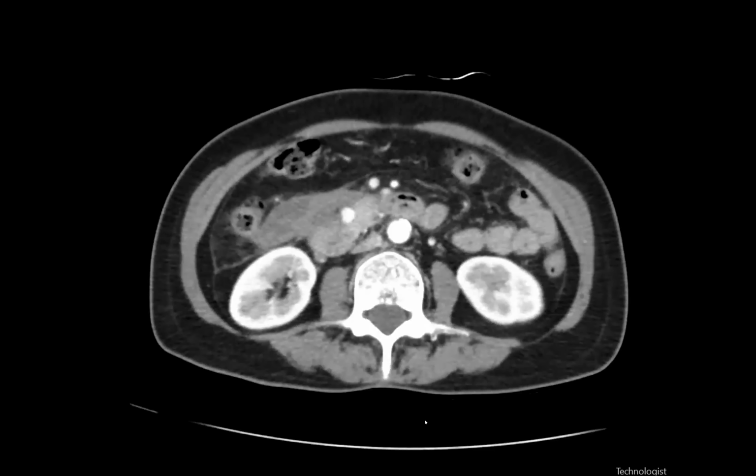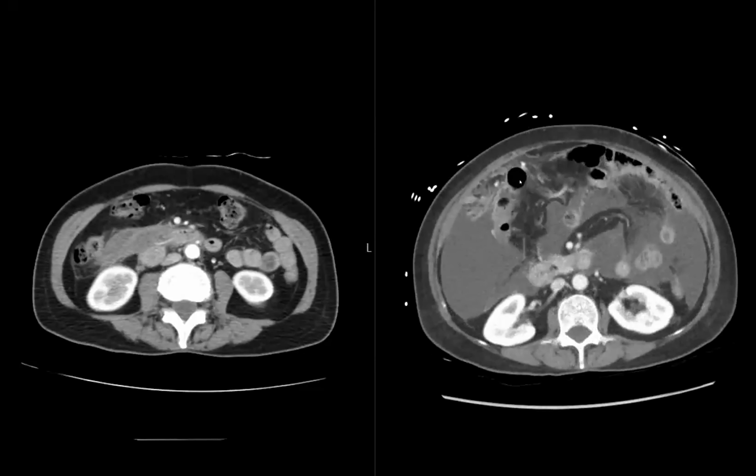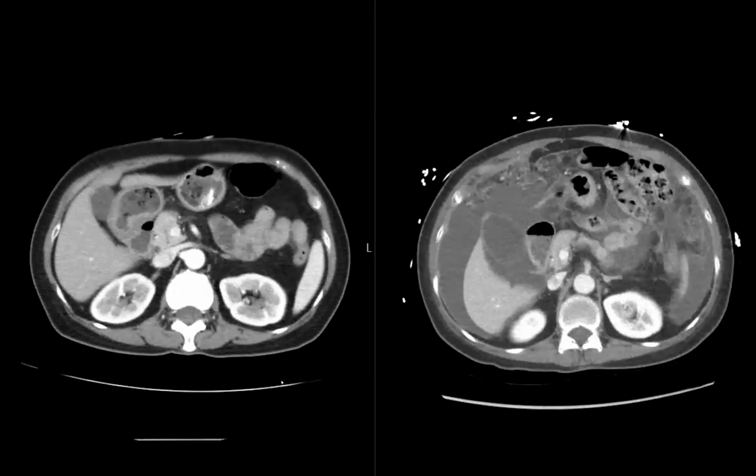Can you do a side by side? Because there's a lot on the pre-treatment CT. Okay, hold on, let me try. It's really sad. Oh, here. Hold on, please stop recording for a second. Okay, so this was the original, the OG. Stop in this region. And then this is the new exam.